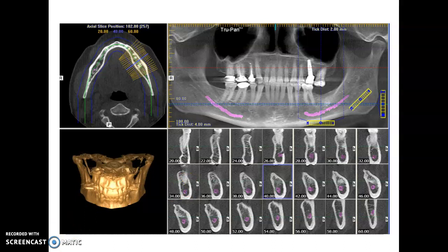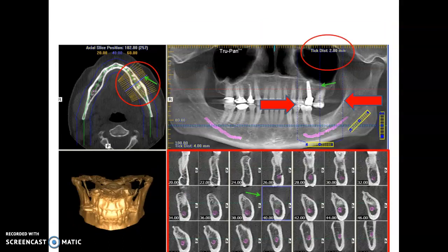Okay, so that's that image. We'll look at a kind of a different little slice here. This is just showing you everything that I just went through. So you've got the blue line here. The blue line here is the same square here. So all of those are connected and showing you how they relate to one another.